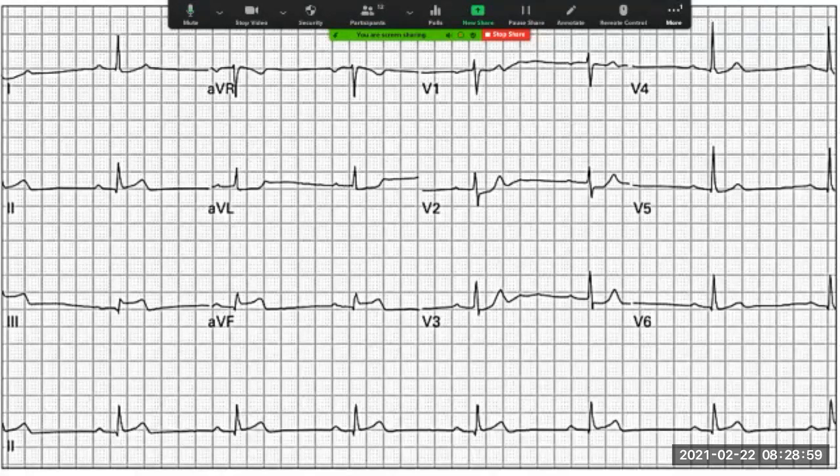So once you have reciprocal changes along with ST elevations, it increases the chances of ischemia. And we never forget about AVR on that side, although this one here is not too bad. So we've said that we've got an inferior block, or rather an inferior ischemia.